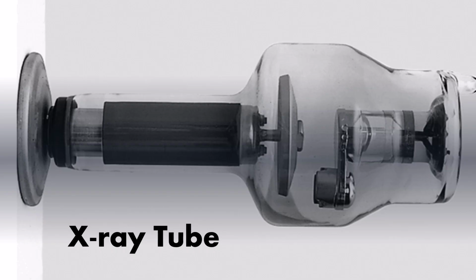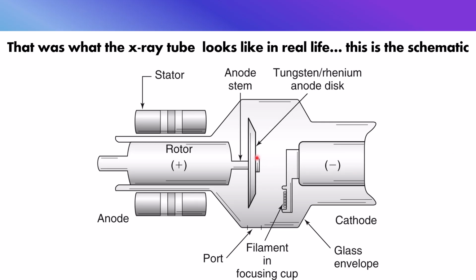This would be an X-ray tube, what it would actually look like inside of the X-ray machine. If you could take off all that tube housing, this is what it would look like with a rotating anode and a cathode here, and these are the different parts. If we look at it in a schematic, you can see this is the anode, which rotates, it turns around.